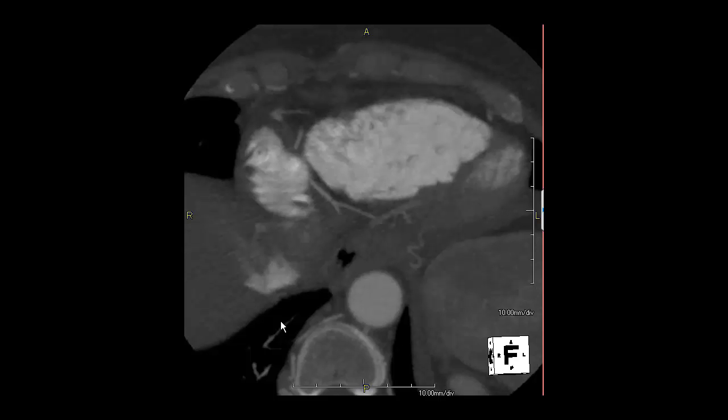We have no information on left ventricular function. Her left atrium appears to be borderline to mildly dilated. There is a concern of a thrombus or pseudothrombus in the left atrial appendage. There are 5 separate pulmonary veins, and she has evidence of diffuse and possibly borderline or equivocal obstructive disease in the left anterior descending and in the right coronary artery.